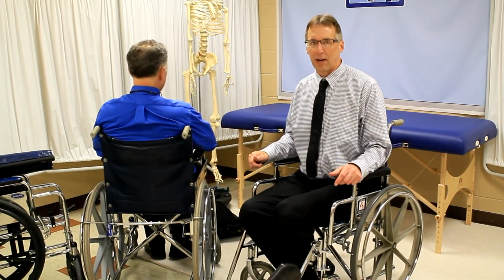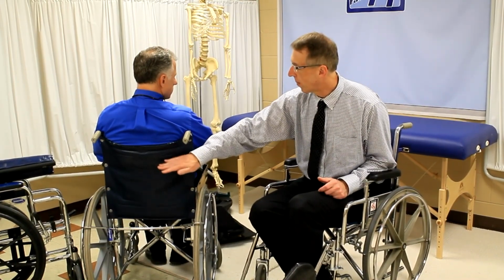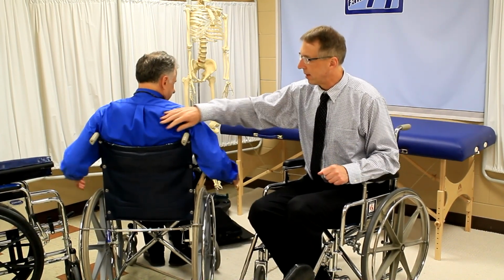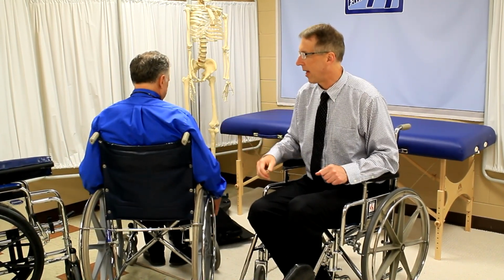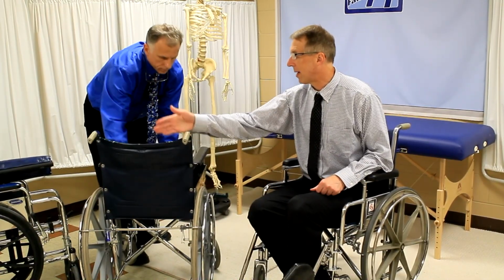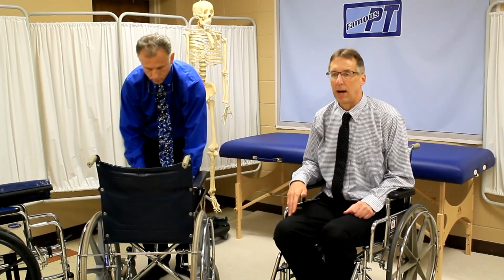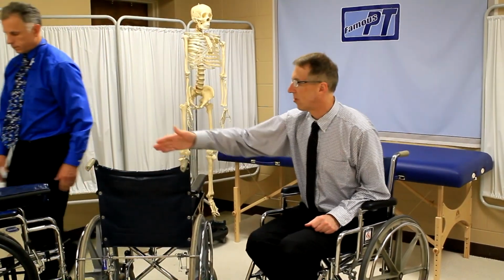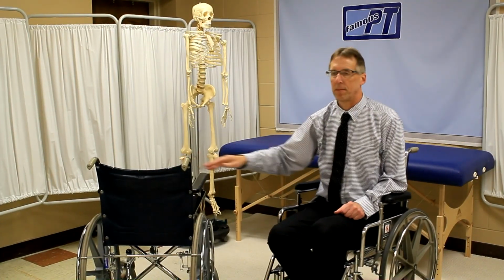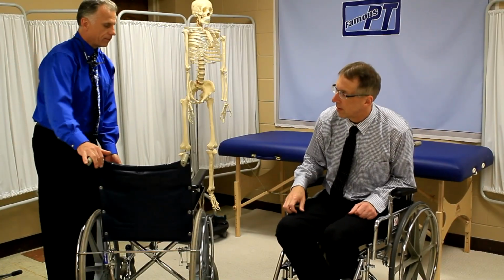If you do a lot of wheeling, or let's say you have a chair for sports, then that's when you see the lower backs because they want to be able to move their arms. And this kind of gets in the way of that. So that's the difference. For the vast majority of people, I'd say you want a little more height, to be honest with you. There are attachments with some chairs too that you can actually go all the way up and support the head too. Those are typically for people who need support because they cannot lean forward independently.